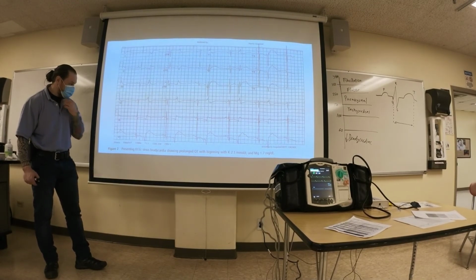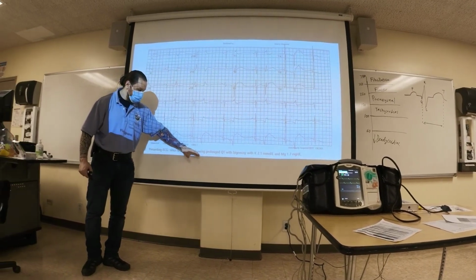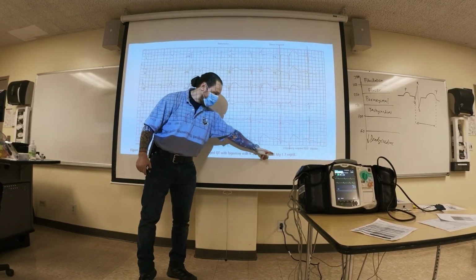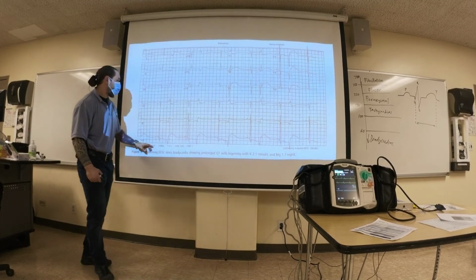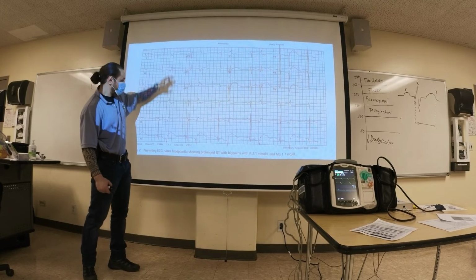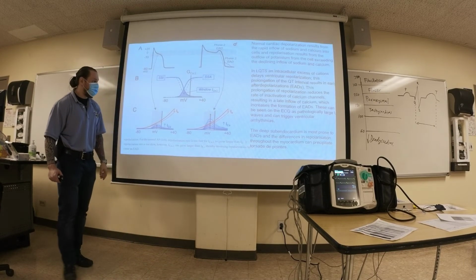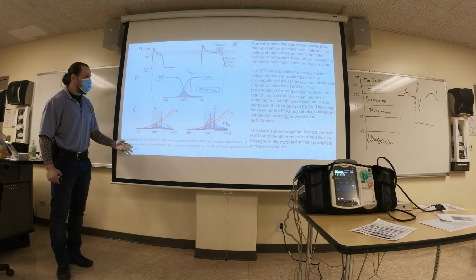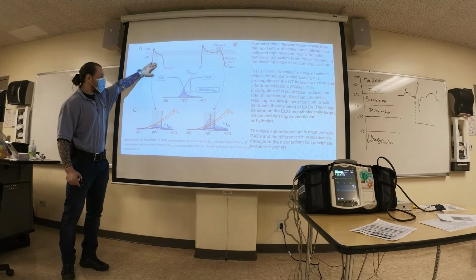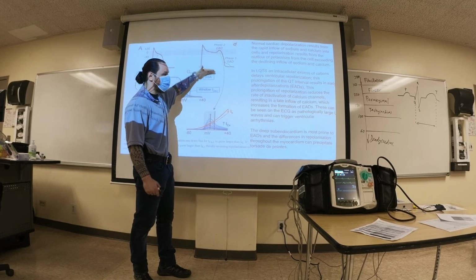So here, just to show you, there's another EKG. This is sinus bradycardia. It shows prolonged QT with a bigeminy pattern. And this person, very important, has low potassium, and will have low magnesium. So you see here, these are your P, QRS, and then you have some beats that are falling here, and this can cause this ectopy, R on T. So what happens here? In this phase, when you have a prolonged QT interval, this was your normal depolarization cycle. And when you have this abnormal phase, you have this prolonged because your phase now becomes longer.